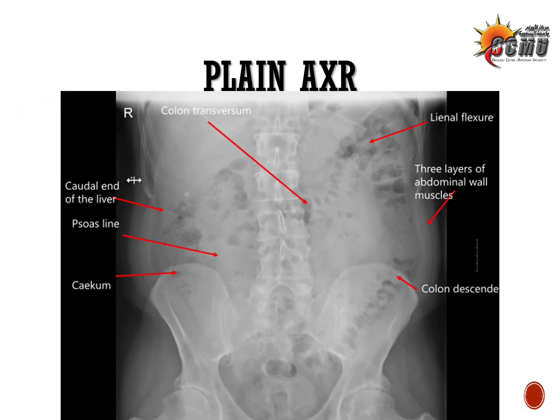Again, this is a normal abdominal X-ray, and you can see the shadow of gas filling all of the large intestine. It's like the large intestine is being drawn by gases. It's very clear. Gases in the cecum, the transverse colon, and the left colon, even the sigmoid downstairs.